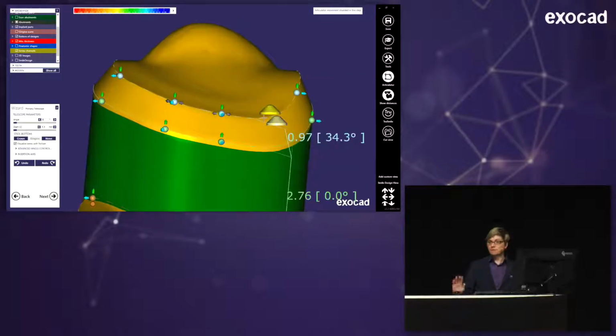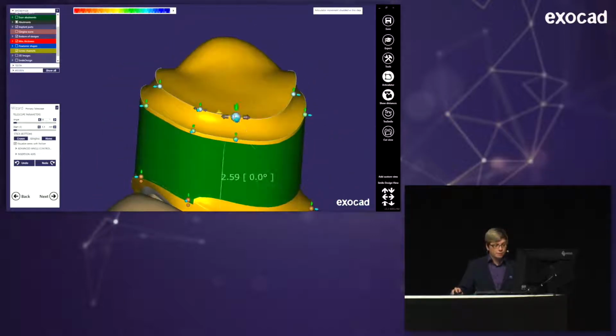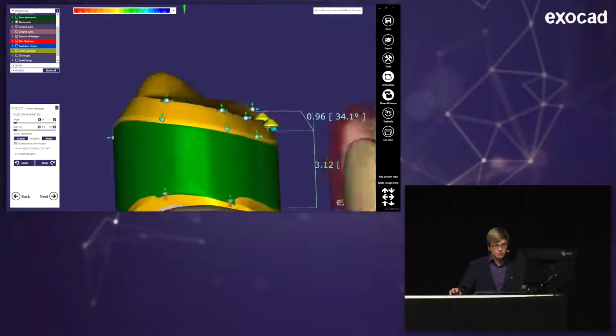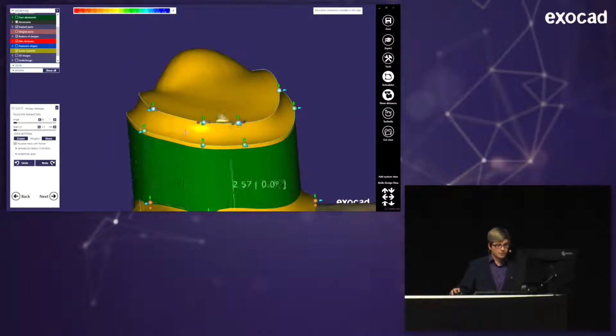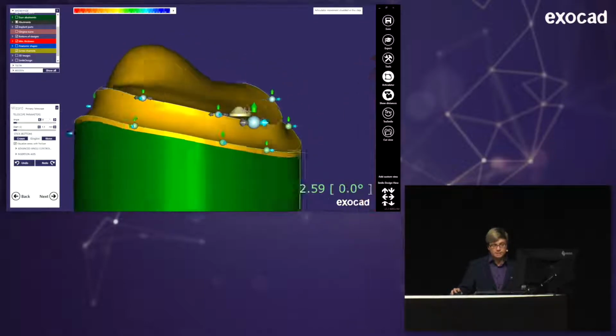And you may, if you ever design telescopes using this module, have seen those weird yellow and green buttons and maybe already hit them by accident and wondered why everything looks different now. Those actually show what kind of surface the area between 4 points actually is. The green one is the parallel surface. The yellow one is just a conical surface. So if I hit this, it changes. For now here, normally it's the yellow one. I'm changing it to green, so I get a bit of a shoulder because it tries to design a parallel surface here. And I'm also hitting other buttons. If I pull this up, you see the parallel surface. But for a shoulder, this is enough.